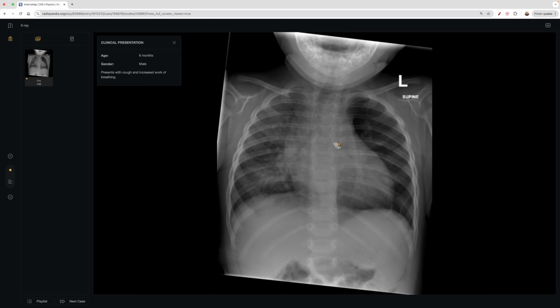So they have this, and it looks like it's lodged in their left main stem bronchus comparatively to their right main stem bronchus, which is patent. And this is still patent. You can actually see behind it, but it's just the fact that it's not obstructed.